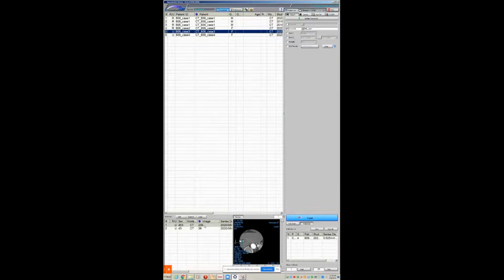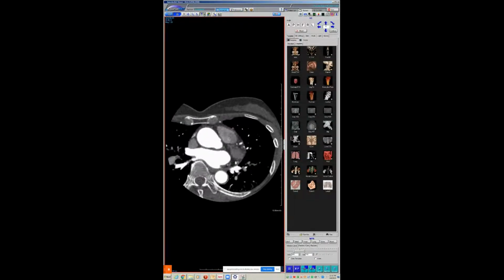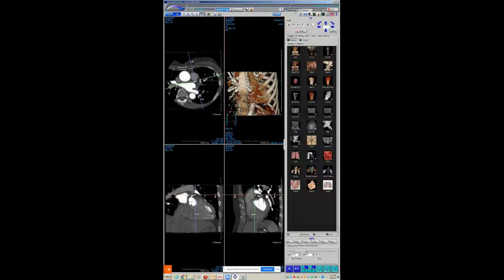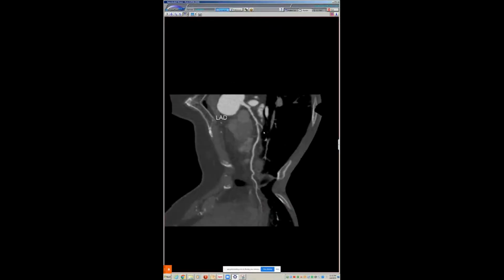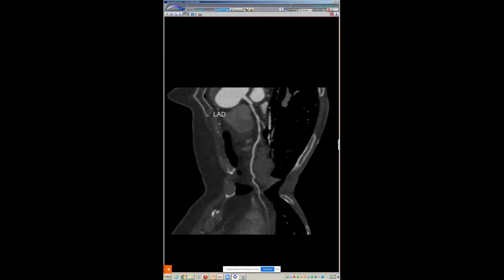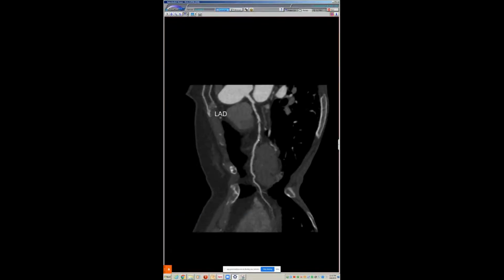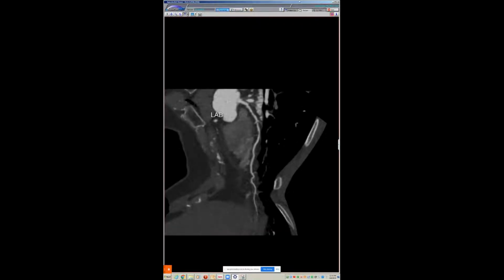And then this is, which patient is this? Yeah, so this is a case I came across yesterday, and this just shows some of the utility of some of the technology we have. Let me just pull this up, it'll be easier. So here's her LAD, and this thing, well, you want to call that mild, it's approaching moderate. Another stenosis here, probably moderate. But if you look after this, there's this trifurcation between a diag and a septal in the LAD.